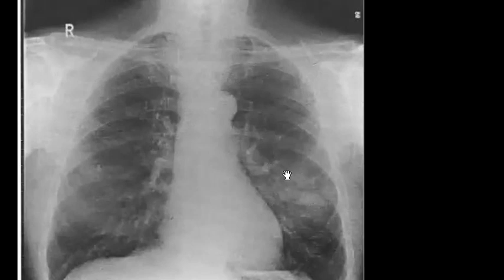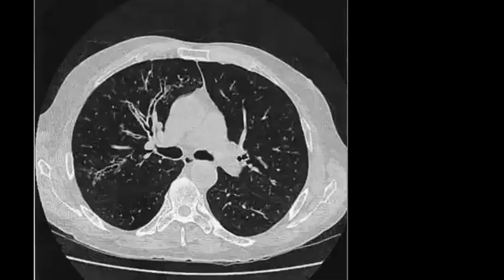I understand that maybe the tubular appearance is not very obvious, but in this case, I think you will go in the management that you need CT, or maybe you check if this patient did high resolution CT. So let's shift to the CT and see how it looks. So this is the first cut of CT, which is selected images.